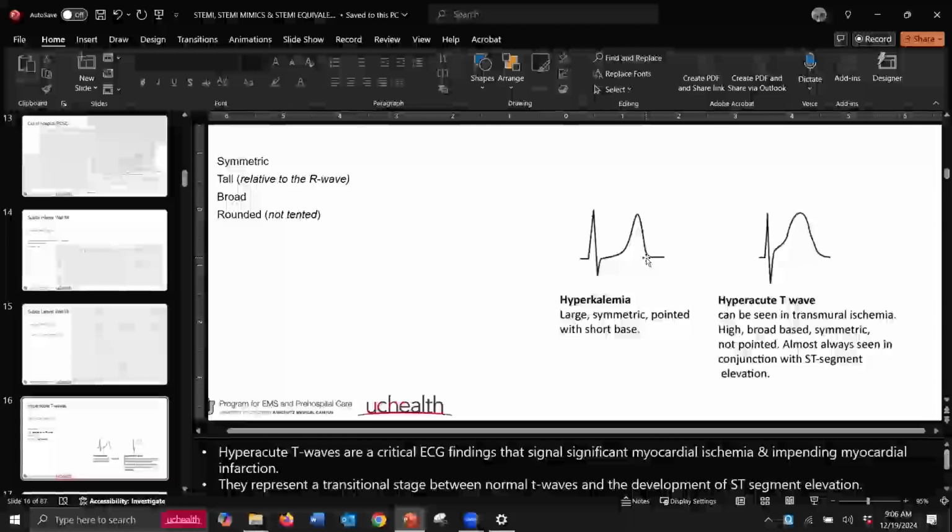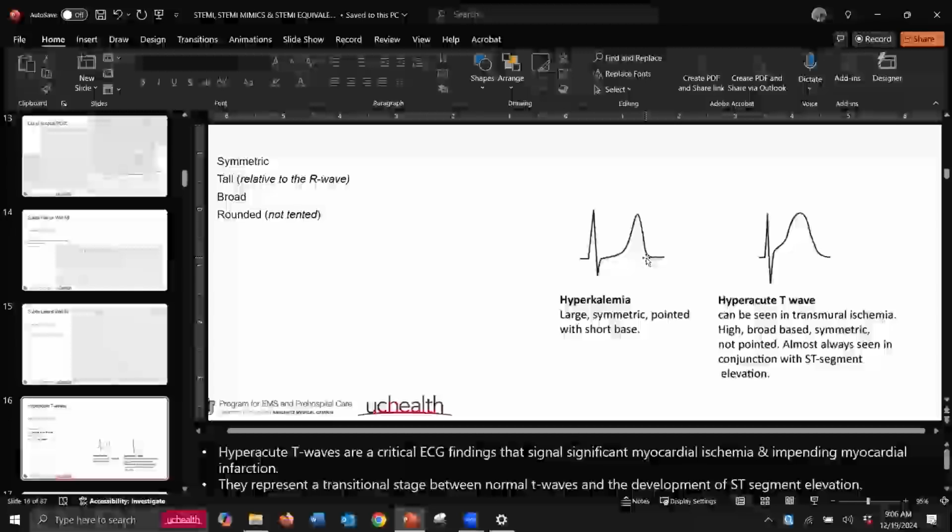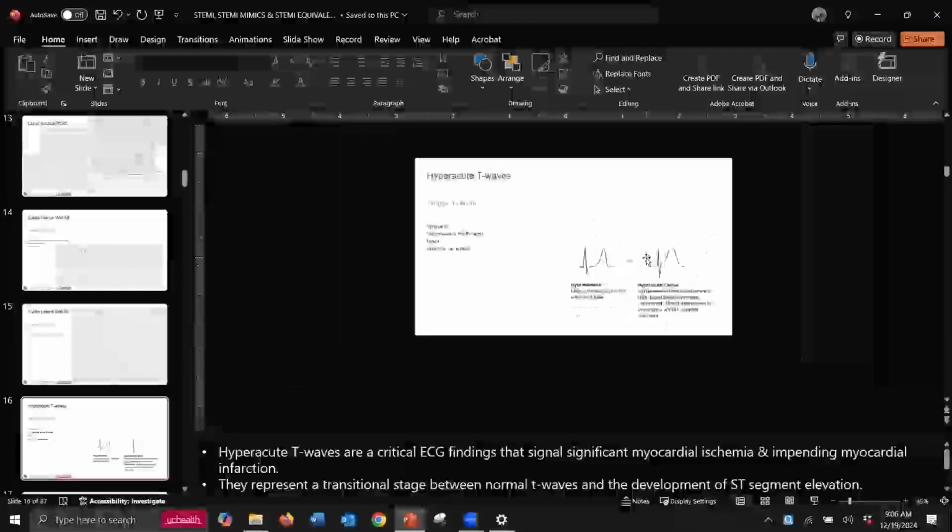Or the Winters? DeWinter, sorry. Not Wellens. Wellens is totally different, right? You've got type 1, type 2, or type A, type B.